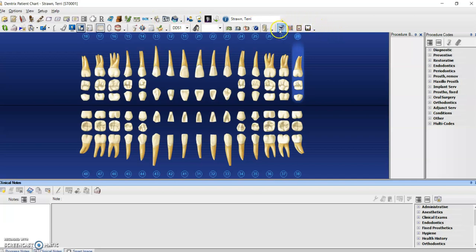The other ones that we will be using a bit more, or you would be in an office, would be the imaging buttons here. So one thing, instead of going into DEXIS completely separately, you can actually see the images within Dentrix here by doing this. So if I would click the acquire this image, it would then flip into DEXIS automatically so that you could get your radiographs.